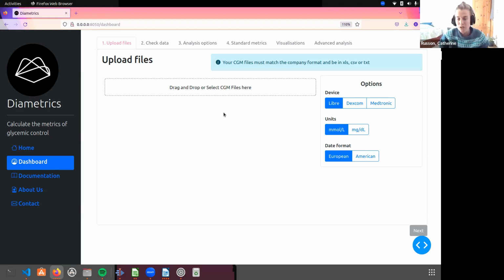So what I'm going to do in this video is blast through the whole web app, assuming that everything works smoothly, and show you how to do it. If you're having specific concerns and areas that you're finding difficult, go to the documentation below, and there's more in-depth videos about all of the different areas and all of the different tabs, which should hopefully be able to answer your questions. Okay, in this video, I'm going to take 3 Dexcom files in a European format, and I'm going to go through with you the whole way through the Diametrics page. Okay, so let's get started.